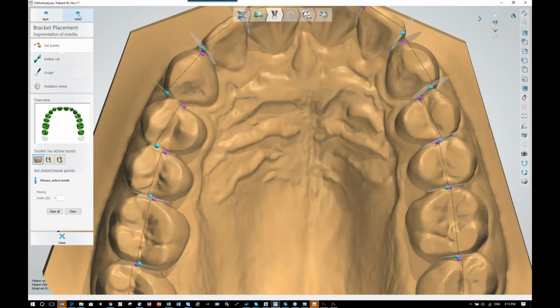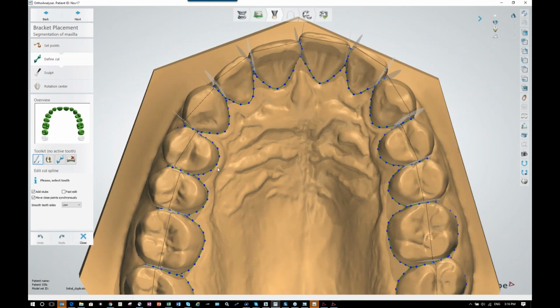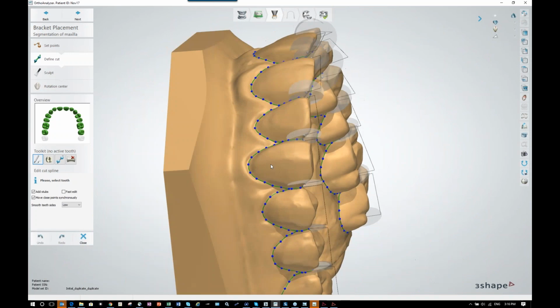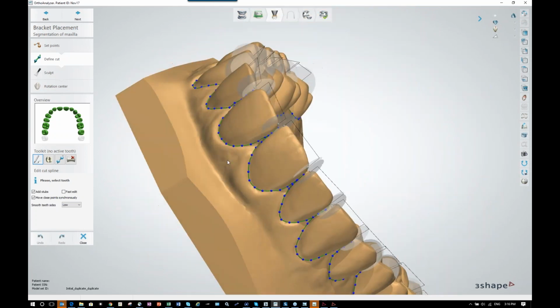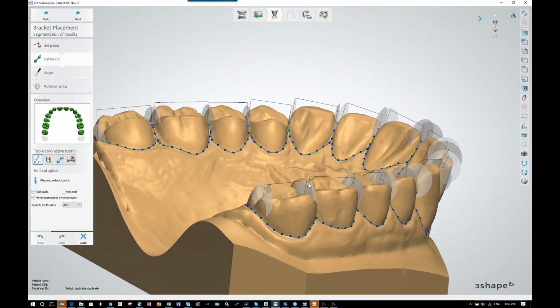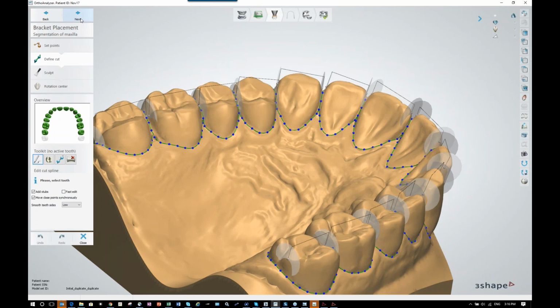After that, we click next, and the software starts to calculate, measuring each tooth. It gives you the status on the lower left hand of it. After it calculates, it also captures the gingival line, so later on it knows where the gums and the teeth are. When we're moving it, it gives you an accurate movement as well. All we have to do is check around the arch, making sure everything's captured well. If you put the right points accurately, it will have no problem determining where the gingival line is. Click next. Then we have the sculpt tool.